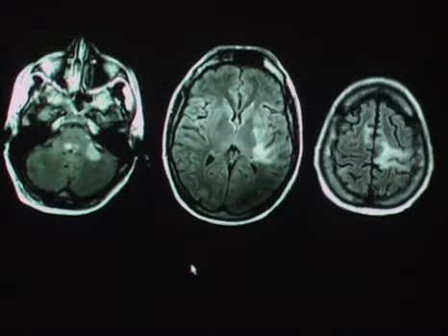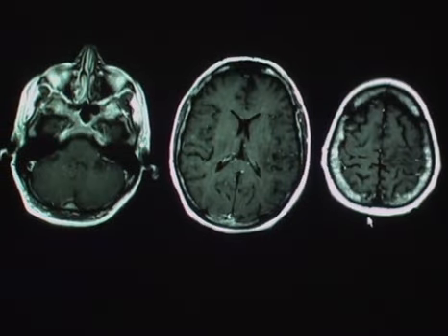Here's another case of a patient. This was a transplant patient, but with several foci of signal abnormality involving the brain stem, as well as white matter, again extending to the convexity. And here, more clearly than in the last case, you can see that there's some focal mass effect that's associated with this, but again, that we're pretty much sparing the gray matter here. And some post-contrast imaging nicely demonstrating that the majority of these lesions are non-enhancing. Again, the same lesion here, some mass effect, again with sparing of the gray matter.